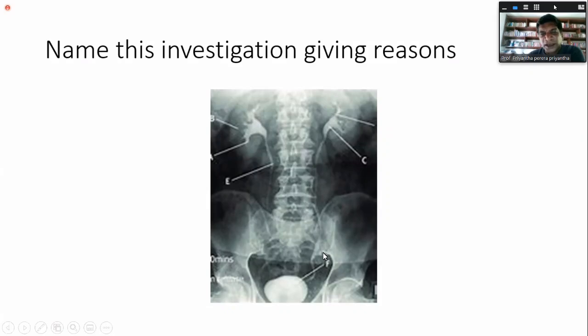Right? In MCUG, the urine just goes up like that and demarcates the ureters just like a straight line. No interruption in the tubes, right? So it's a straight line without any breaks in it.